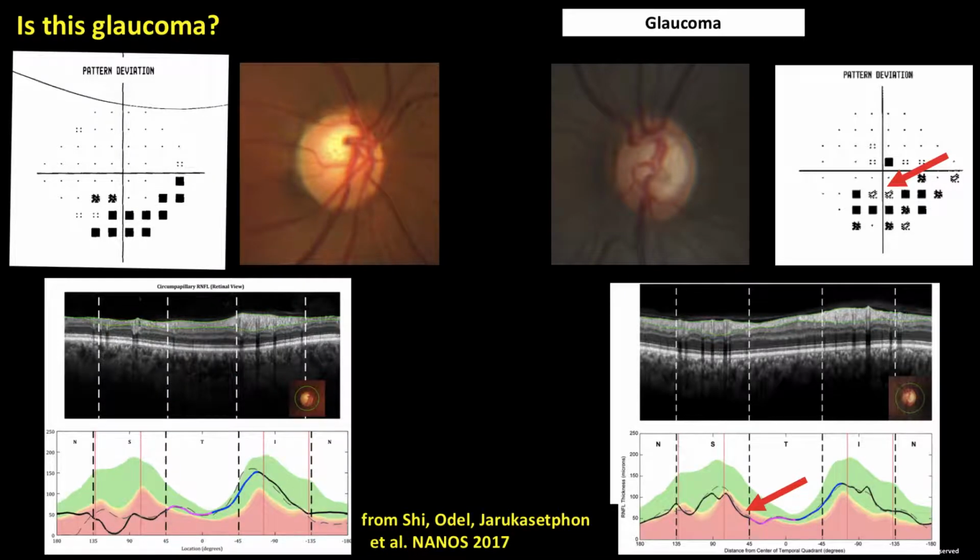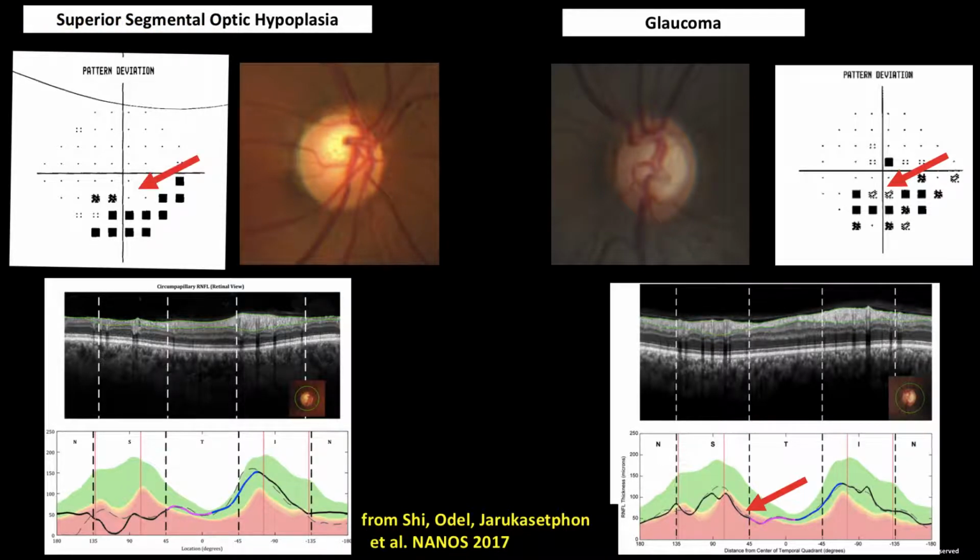All right, what about this? Is this patient glaucoma, right? Well, notice that the field is worse near the disc than in the nasal region. That is not typical of glaucoma.